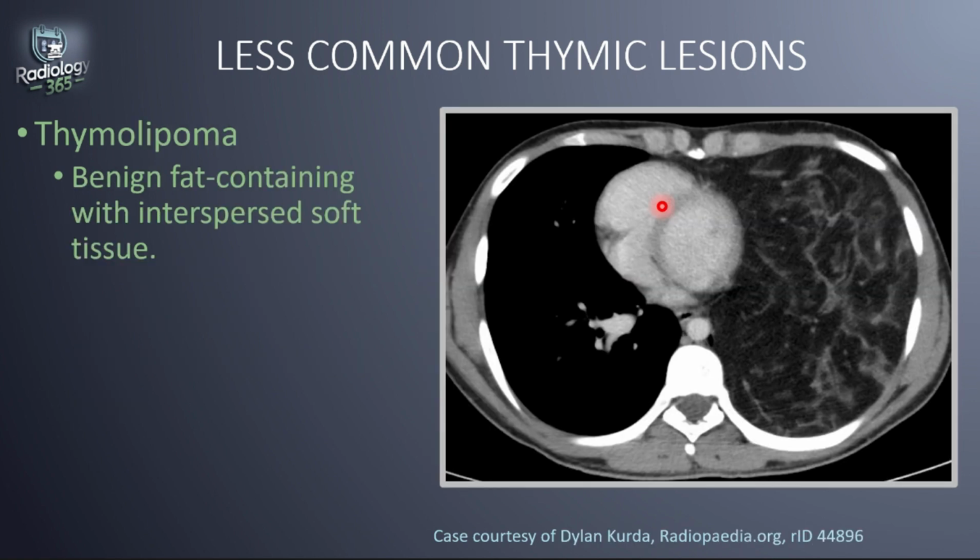Next, we'll talk about a thymolipoma. This is a benign fat-containing lesion with interspersed soft tissue.